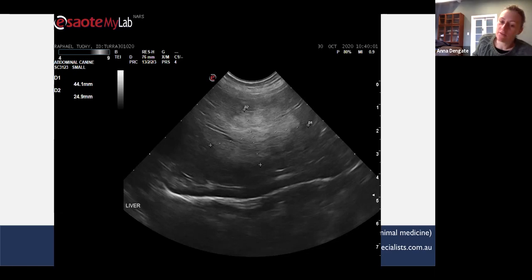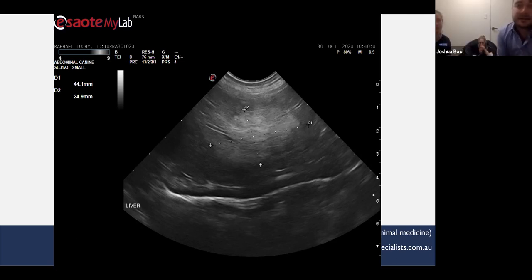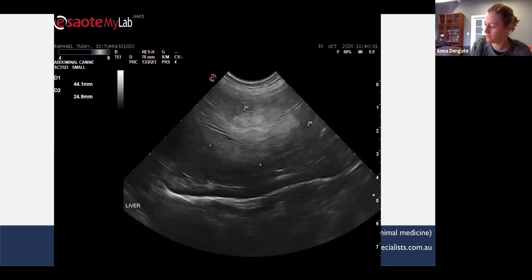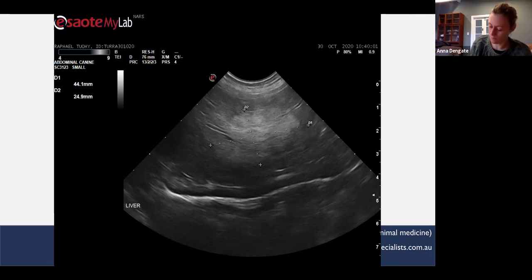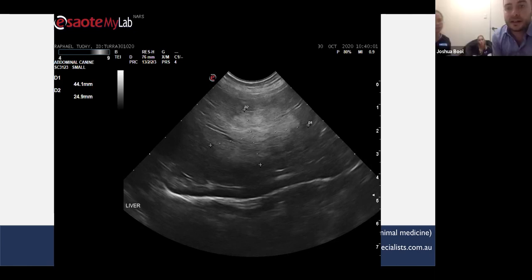What are the differentials for a hyperechoic nodular lesion in the liver? I'd be thinking things like infiltrative or increased cellularity, creating them to be more dense. That's why we're getting those kind of echoes. Yeah. So things like inflammation, or hemorrhage, or neoplastic cells. Jess also just mentioned that things like fat can also increase echogenicity. Good.